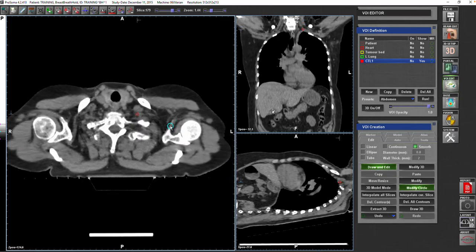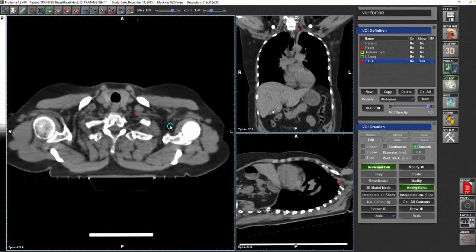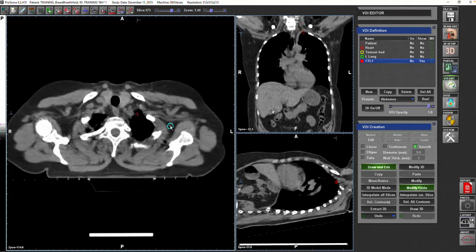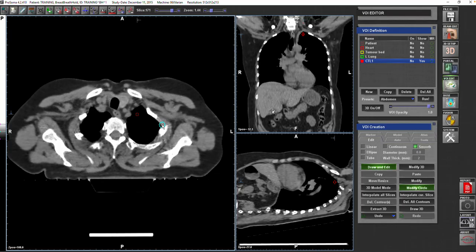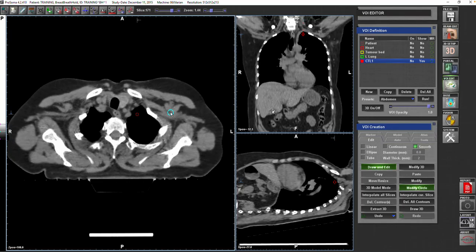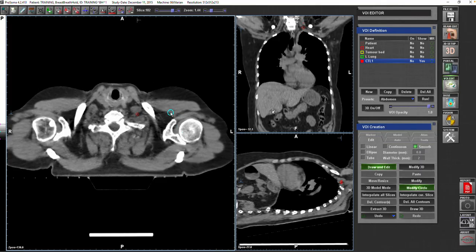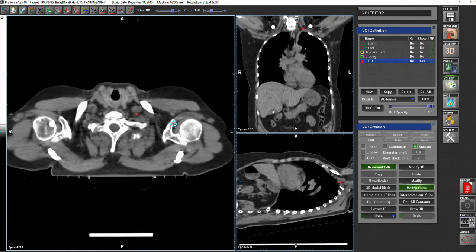We see it, by the way, in the X-ray, and it is the lateral border of the supraclav field. When we go for the supraclav field in the target volume delineation, I will show you how to place the fields anatomically. You can stop your lateral border just at the coracoid process or medial to it. So this is a very important landmark that you need to familiarize yourself with.